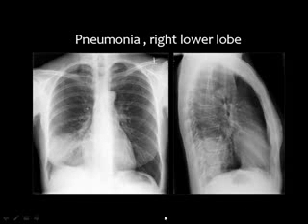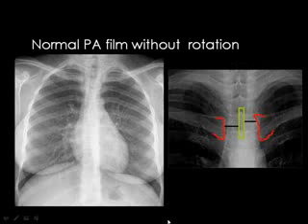And if you go to the frontal view, you can see that there is a pneumonic consolidation in the right lung base that has been projected posteriorly.